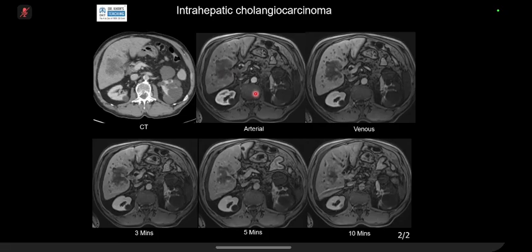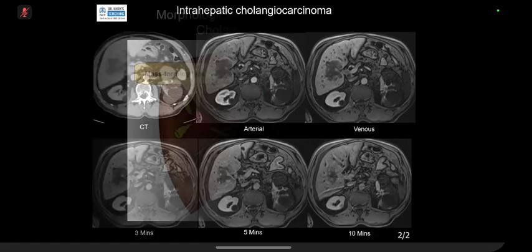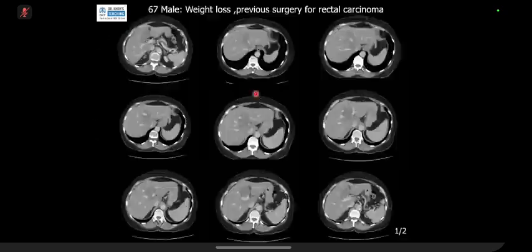Please remember the differential for this is hemangioma. But I'm not teaching you in great detail here, but we have got a lot of parameters for what kind of enhancement in early phases you have in hemangioma. You can confuse hemangiomas with intrahepatic cholangiocarcinomas, but with the features which we have, we can actually discriminate between the two. But so the fibrosis shows delayed enhancement.